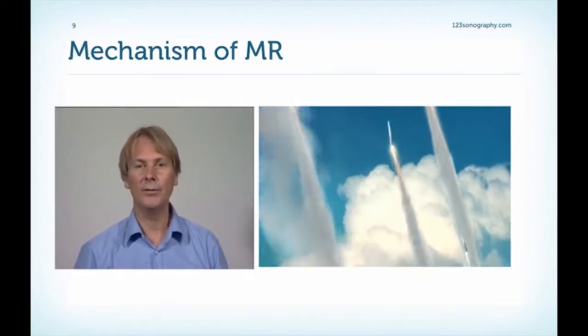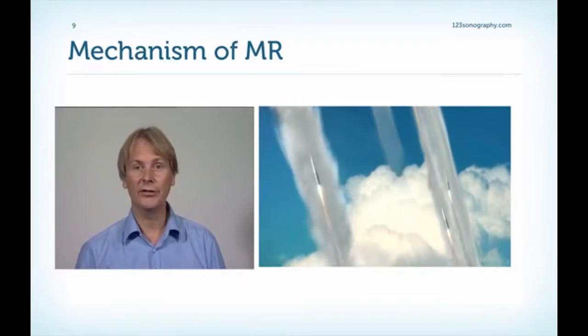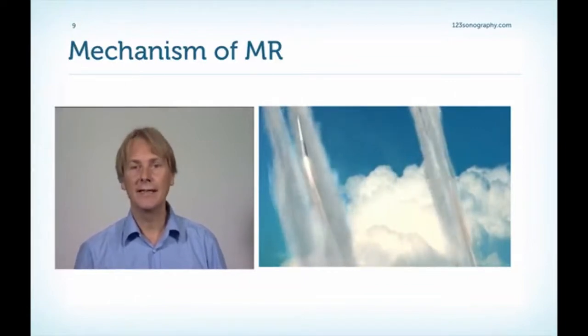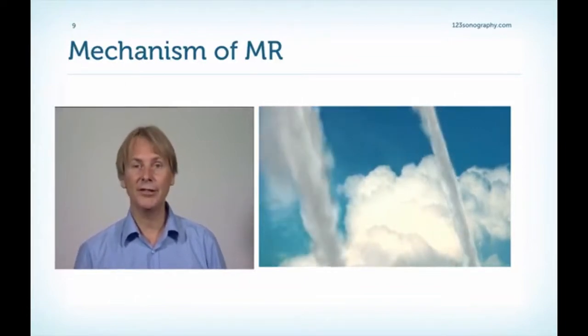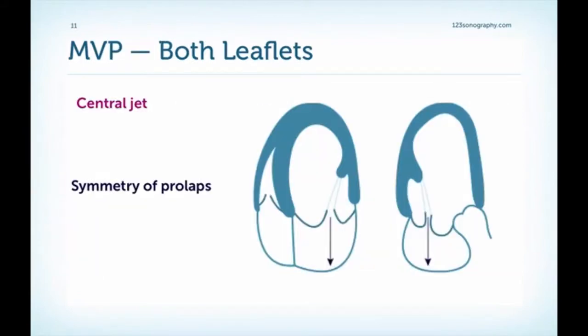Echocardiography and color Doppler not only show us where the jet came from and how severe the regurgitation is, but also what the mechanism of regurgitation is. So the direction of the jet is equally important. The first mechanism I'll discuss is the bileaflet prolapse. Remember, in the chapter on quantification of MR, we already saw an example of a bileaflet prolapse.